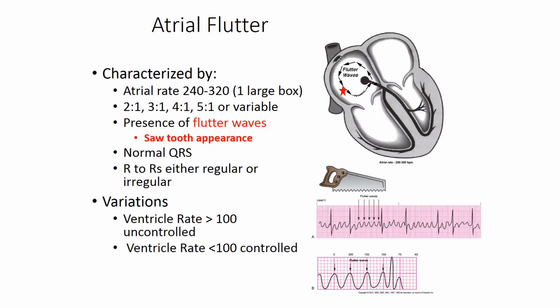So with atrial flutter, your key signs are this sawtooth pattern of F waves instead of P waves, and a ventricular response to those F waves. And the F waves look very similar to each other because instead of chaos in the atria and all of those crazy different bumps, we have one ectopic focus generating one signal from the same place. So the same signal from the same place is going to look the same in the EKG.